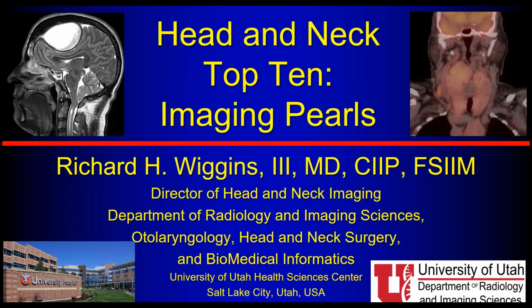So someone asked about sinuses and evaluating T1 sinus lesions. The paranasal sinuses and the nasal vaults are interesting because on the T1 before contrast, the tumor will be dark, the mucosa is dark, and the turbinates are dark. But on the post-contrast, everything's bright. The tumor's bright, the turbinates are bright, and the mucosa is bright.